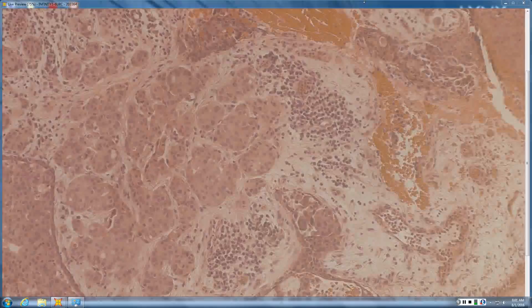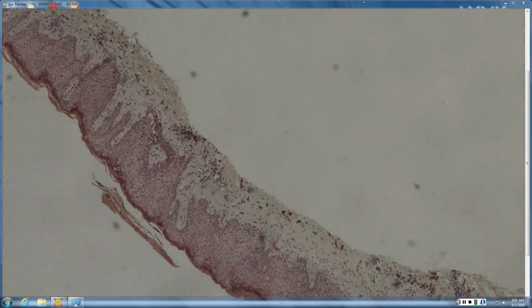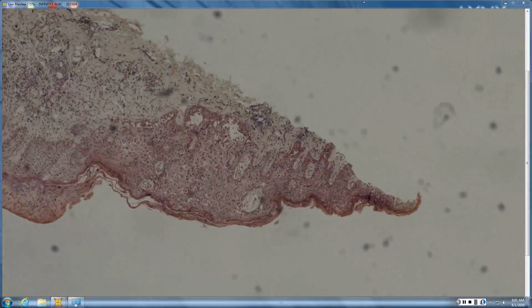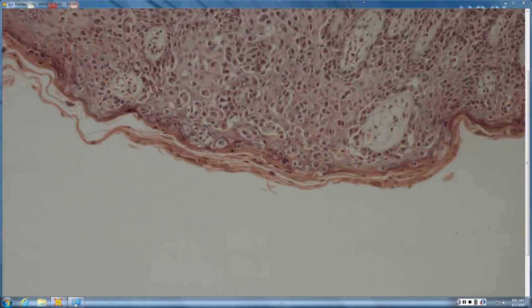So that's one of the clues. Just like you have to remember Mets, epidermotropic Mets to skin, there are also adnexal structure tumors and salivary tumors that can connect up with skin and become epidermotropic and grow as Paget's. So there's definitely pagetoid spread here.